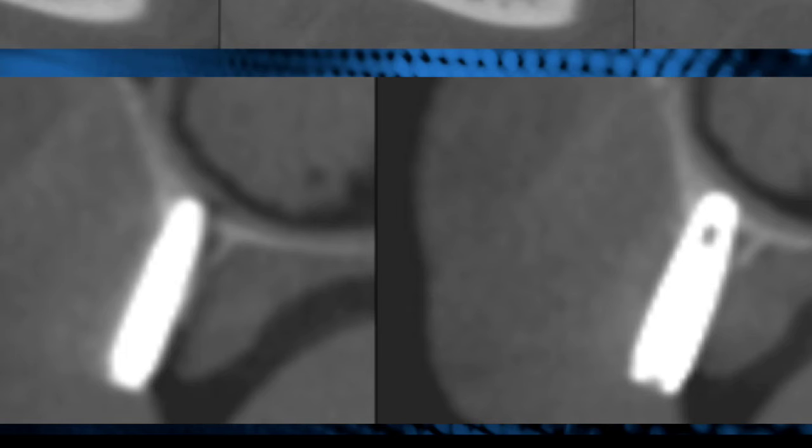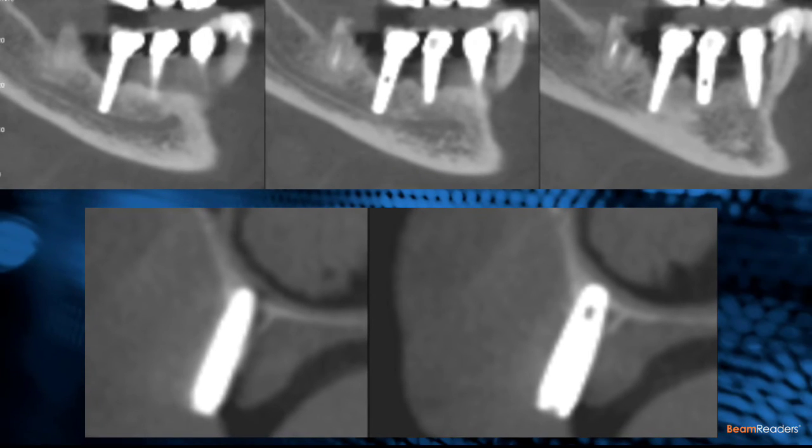And it's really hard to delineate beam hardening artifact from legitimate bone loss around an implant. I will usually take a look from the axial view and work my way down and take a look at whether there's symmetry in that radiolucency around the implant or not. Generally, your pathology is asymmetric around an implant, whereas the beam hardening artifact is a little bit more symmetric.